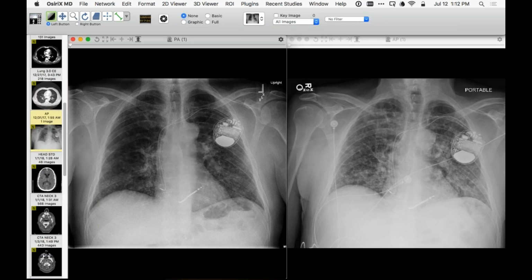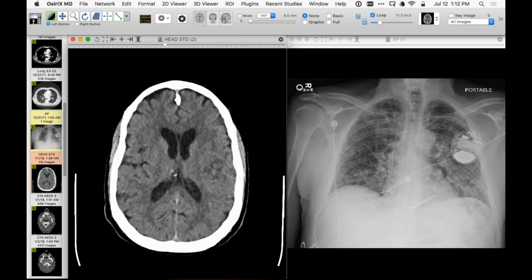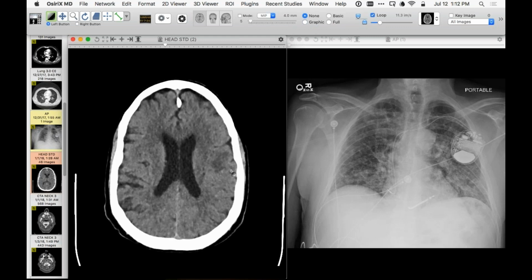that he did have what was really thought to be a stroke, basically. There's this area of low attenuation right here that was consistent with an area of ischemia. I don't have all the images, I have some, but he had a workup for the stroke over a period of days. The workup included evaluation with the neck CT, of course, to evaluate the subclavian and the carotid vessels and so on. So at that time, he was also diagnosed with a stroke, or what could be a stroke.